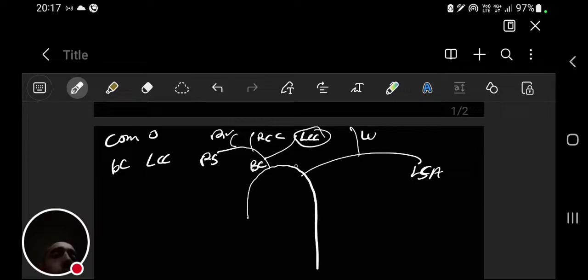This is the unique part. Instead of coming straight from the arch of the aorta, as it usually does, it comes from the brachiocephalic, which should only give the right-sided branches of the arteries from the arch of the aorta.